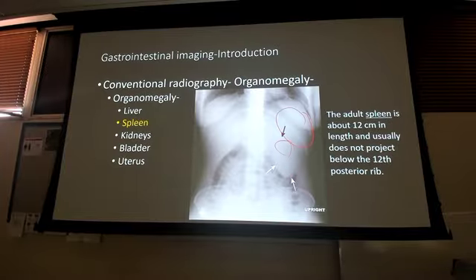My bowel gas should come all the way up here. In retrospect, it's not abnormal. Here's rib 12. Liver is coming down. Here's my bowel. Not abnormal to have an absence of bowel gas in the right upper quadrant because the liver is there. But I should have it in the left upper quadrant because the spleen is not supposed to be there. So that's my splenomegaly there.